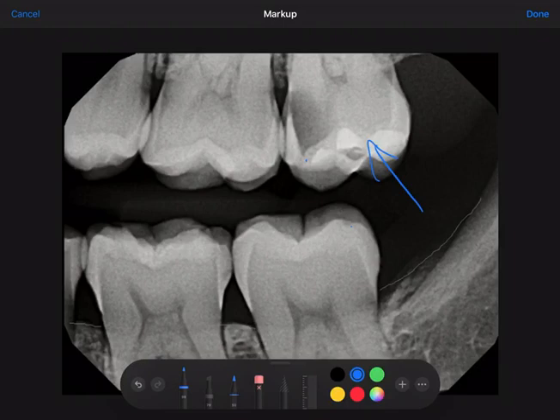So what we're looking at here, and hopefully a lot of you have been able to go through the x-rays with your dentist, but what we like to do at the dental office is that when we see an issue, or even when things are normal, we like to go through the x-ray as well. So I'll quickly go over that now. This is the last molar in the top left for the patient. And what I usually look at is where the bone level is. So the bone is right across here, and it is down here right on the bottom.